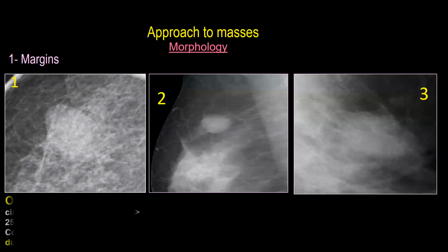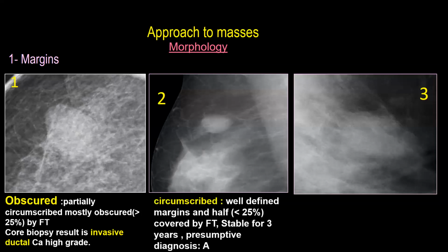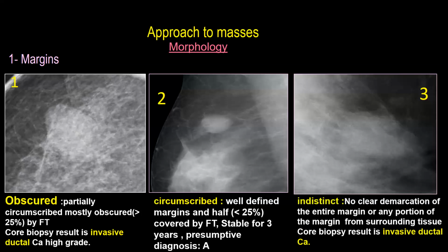Look for the pathology. This one, yes, it is obscured, but the pathology was invasive cancer. And this one, circumscribed, and it was fibroadenoma. And this one, indistinct, and it was invasive cancer.